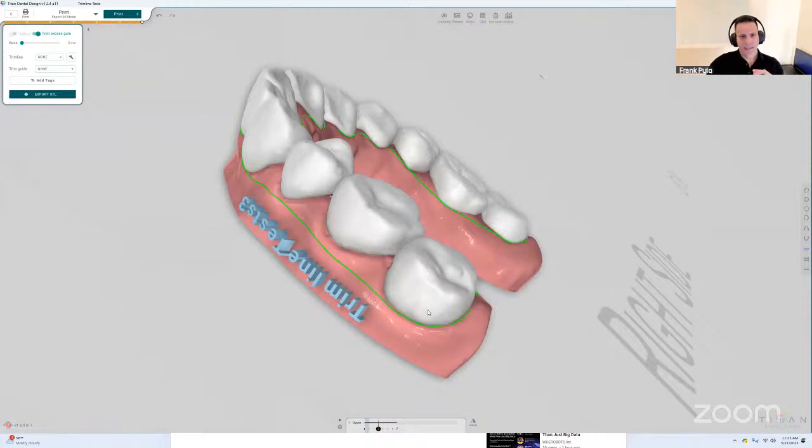This is a guide, and if you're doing the planning and then printing yourself and then cut it by hand yourself, you know where to cut. But if you have a technician that does that for you, you may want to give him a guide so that he knows where to cut.